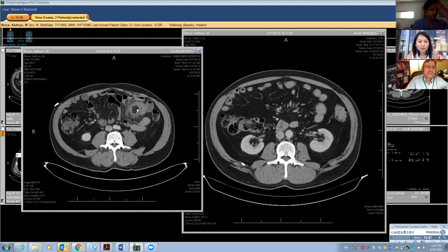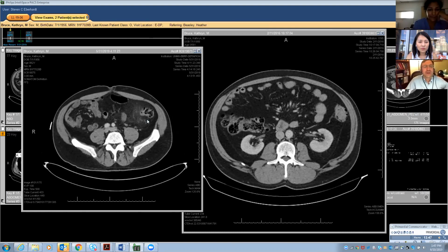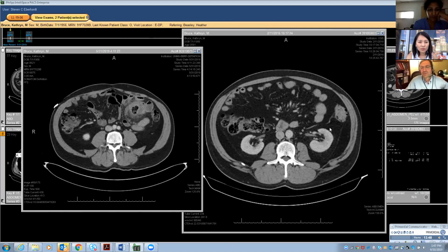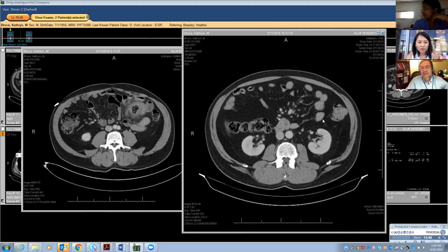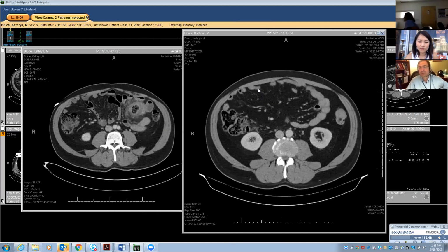In this case, the person did well, and I don't think this was read with a recommendation to follow it up. I think that was in part because we felt pretty confident about what it is, in that the prior was available showing the diverticulum. If it had been a case where we didn't have this, I think maybe follow-up to resolution would have been more warranted. I agree, yeah. That makes sense.